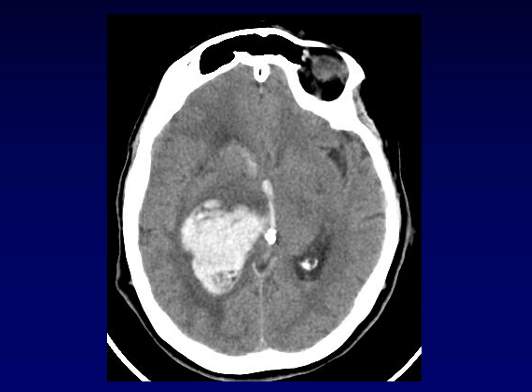Now, this is not just an academic exercise for radiology residents. Being able to attribute a hemorrhage to a particular compartment in the brain really helps with the differential diagnosis. For example, in the setting of a subarachnoid hemorrhage, and if the patient does not have trauma, you'd be very worried about a ruptured berry aneurysm. Whereas in a parenchymal hemorrhage, you might be more worried about a bleeding tumor.